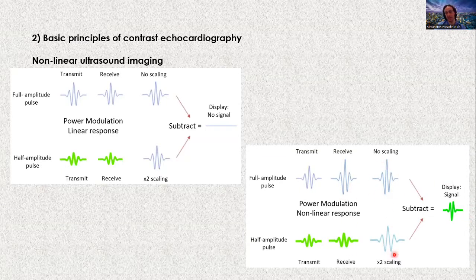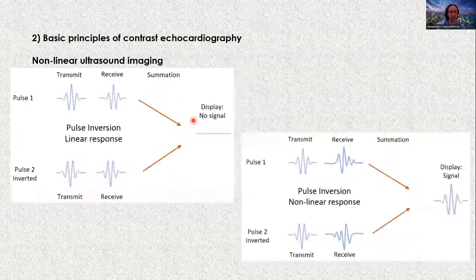In that case, the nonlinear response of the microbubble is enhanced, as you can see here, and the linear response of the myocardium is not. That's why myocardium usually appears black when you use contrast.